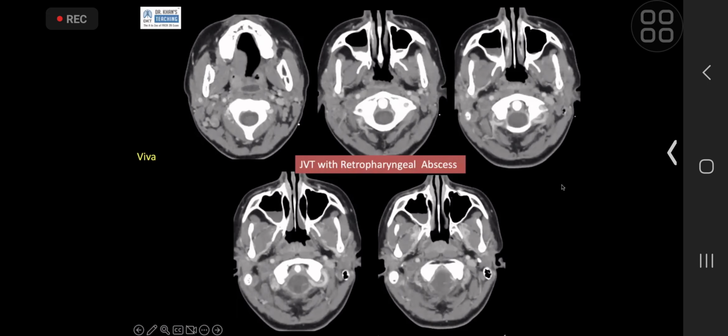But the point is that in cases of infection, it is very important for your 2B. And the candidate did very well, where the candidate was searching for a cause. And in a classical exam case, there might be a second finding, which will be the cause of this jugular vein thrombosis.